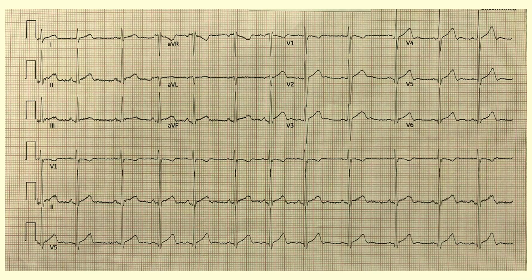Then I repeated the ECG, and all of a sudden it was gone. So V1 and V2 placement, it's super common to see them way too high. Part of that is that people come into the ER and may have defibrillation patches and stuff, so electrodes may get put in weird places, but just be mindful that little changes in the placement of those electrodes can produce some surprising results.